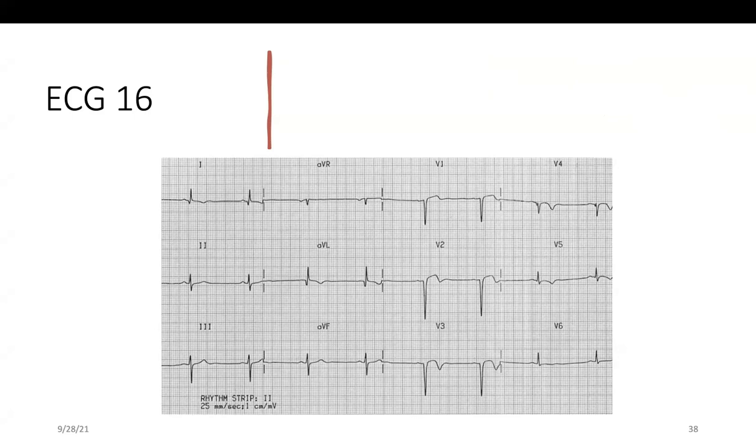Okay, there is a biphasic T wave in V1, V2, V3. So what do you think this is? It's Wellens type A. Look again at V1. What do you see from the beginning of the QRS? Is there an R wave in V1, V2, V3, V4? Q wave. When you see this ECG, it indicates most likely what?